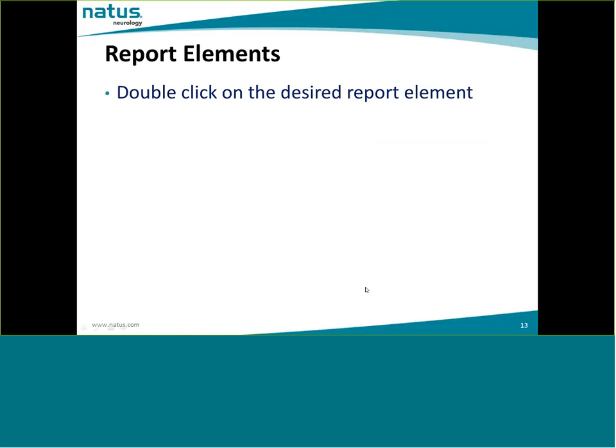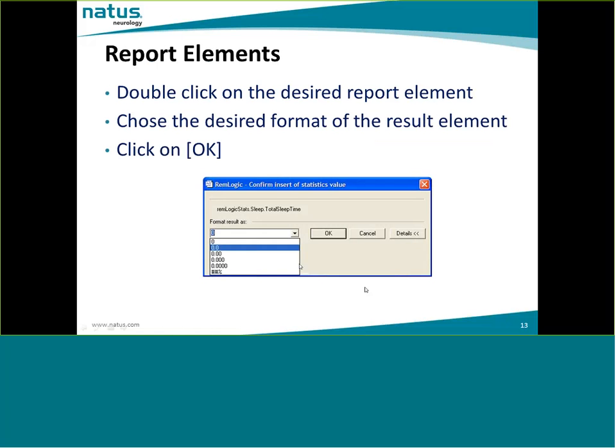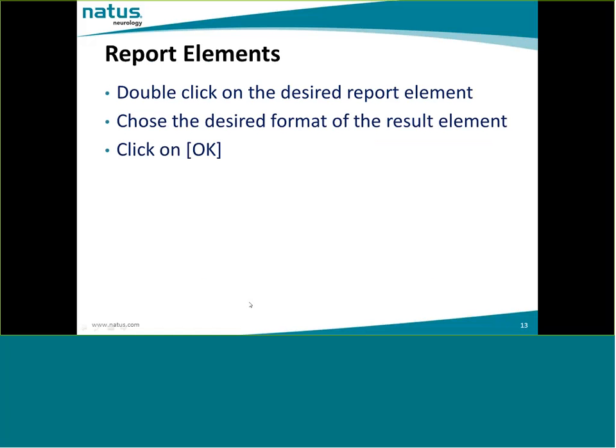So double click on the desired report element, and then you can also change the format of the result. For example, you can change it to a single digit, or you can go for 0.0 or 0.00. It's actually up to your preferences.